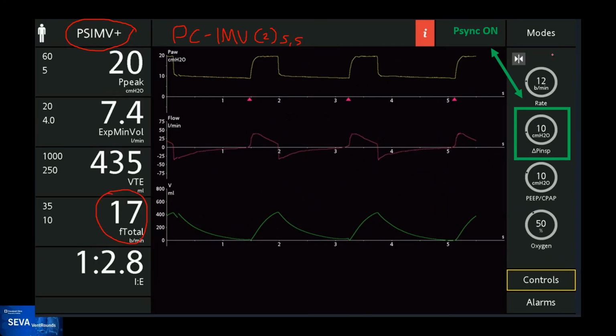They look pretty much alike, but all the mandatory breaths are abolished. And that means that we improved the situation by liberating the flow rate and also by liberating the inspiratory time to a variable inspiratory time, which serves the goal of comfort and also safety because we don't have the early trigger anymore.